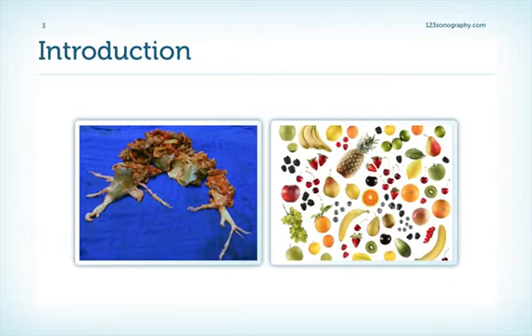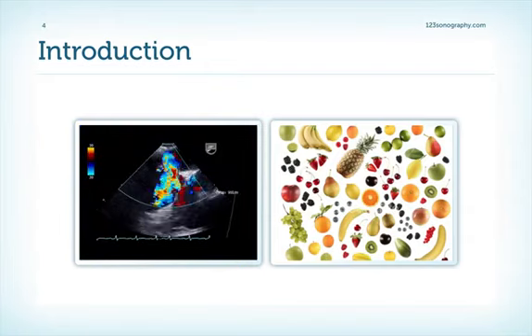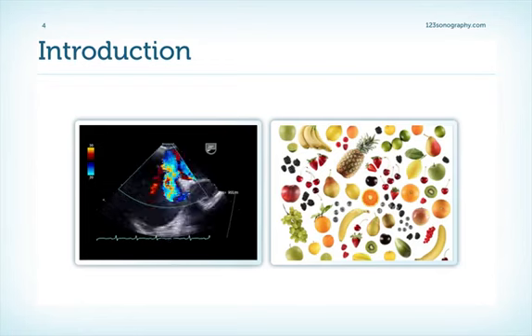But before we focus on that, let's widen our perspective a bit and have a look at various diseases affecting the right ventricle. In some cases, like chronic thromboembolism, as you can appreciate in this huge thrombus that has been surgically removed from the pulmonary artery, or in this ASD type 2, the impact on the right heart is pretty obvious.